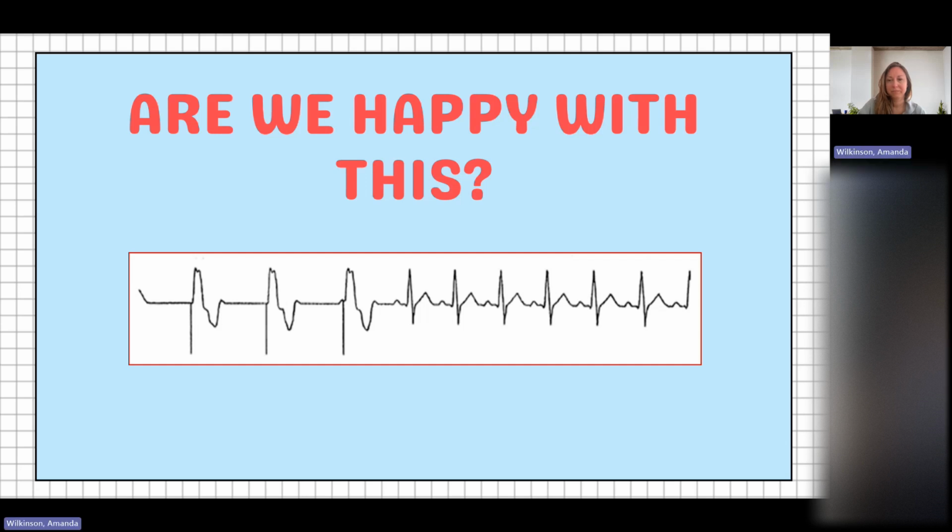Yes, absolutely. I think this is good. I think this is okay for the patients. For sure. This is exactly what we want a demand pacemaker to do. It monitors the heart and it only fires when it's needed. Once the patient's own rhythm becomes fast enough and regular enough, the pacemaker backs off essentially, and that's normal.